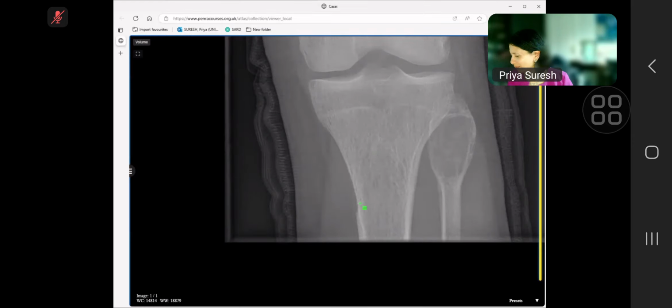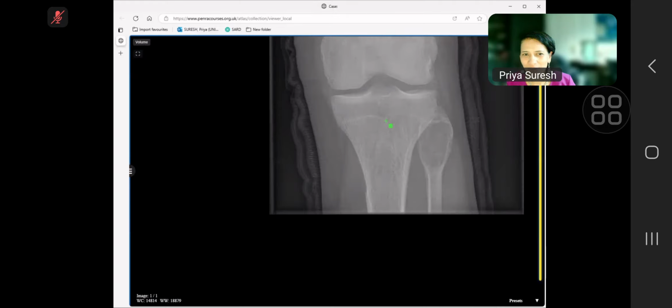You're sort of getting there, but you were telling me GCT, ABC. I was saying, no, don't focus only on that. Look at everything. You did get that the mineralization is not right. It's very coarse, but you're not putting it together. So that's why I was saying, what is your final diagnosis? What is one diagnosis?